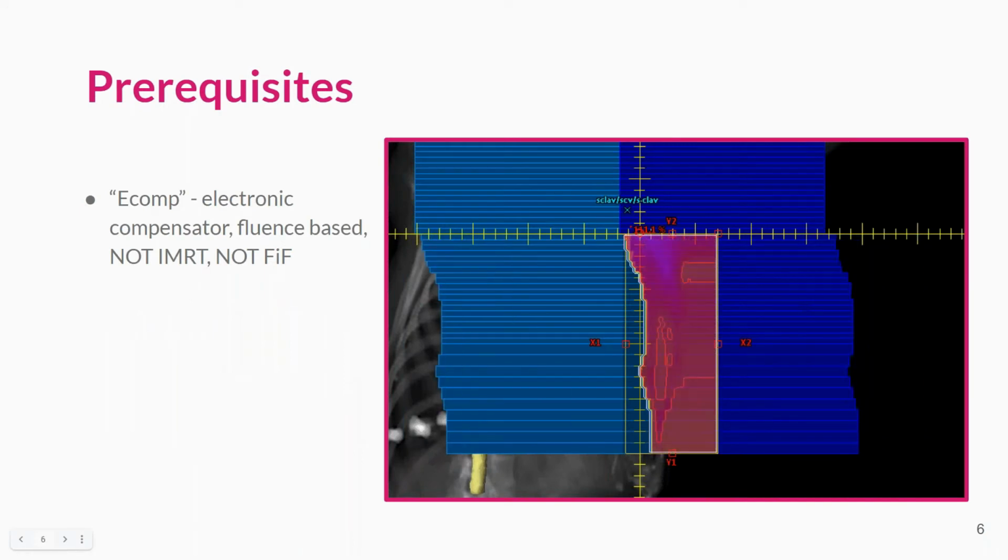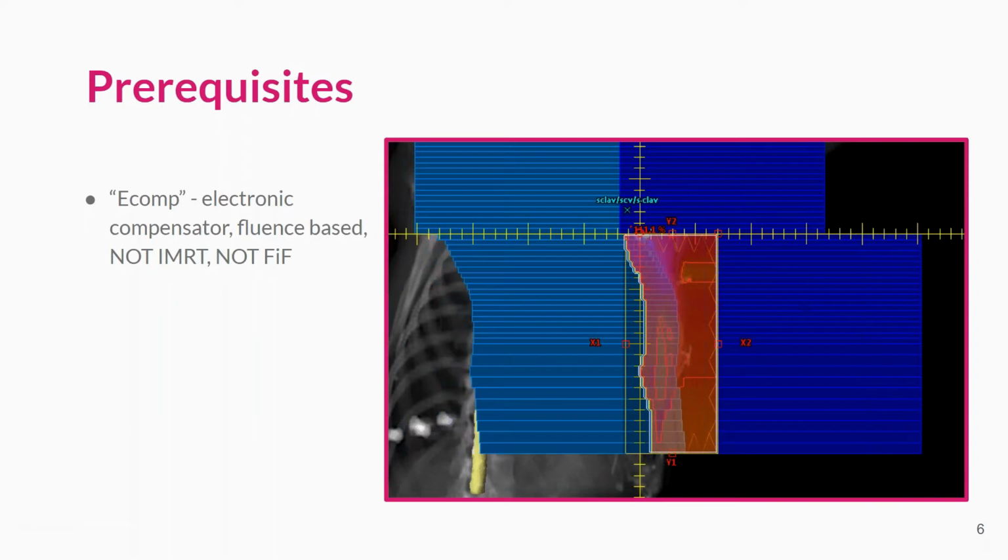Okay, so this is an advanced session. You absolutely do not need to be an expert to be part of this presentation, but it's important to know that I'm going to be going over some features where I'll be glossing over the basic functions of EZFluence.